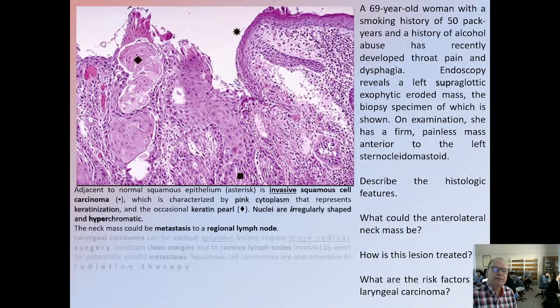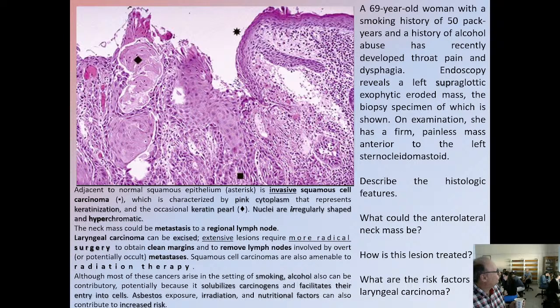Professor, yes, please. Where the asterisk is, do we have normal epithelium? Where we see the asterisk? Normal, yes. It's normal. Expectedly a low-grade dysplasia would appear below. However, because of the tumor there is more dysplasia. It's not so easy to see if it's a reactive epithelium or a low-grade dysplastic one. The discrimination is not so safe.